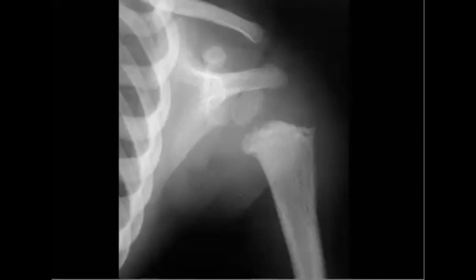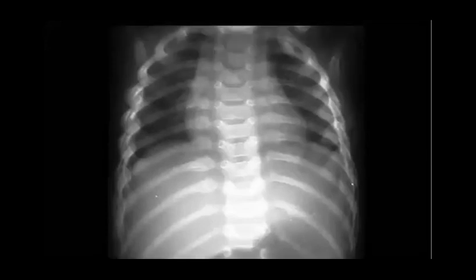And if I show you this one, what do you like to see? Where, and what is your expectation? Rib fracture. Yeah, but you can be more accurate if you mention that it is a posterior rib fracture. Yes, it is posterior lateral non-accidental injury.